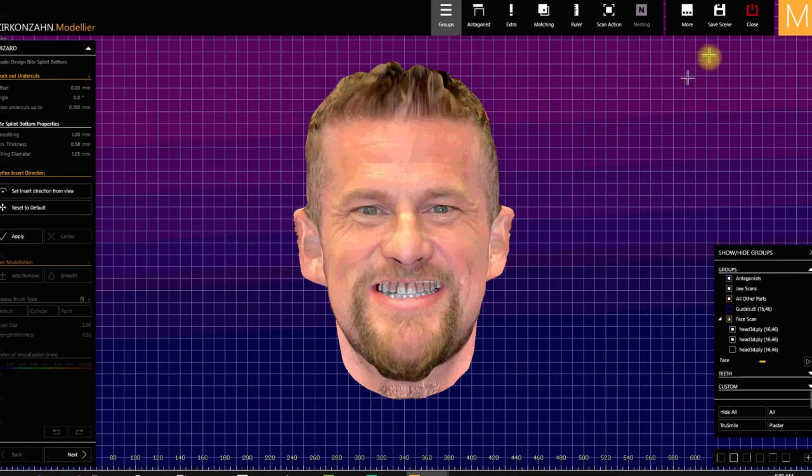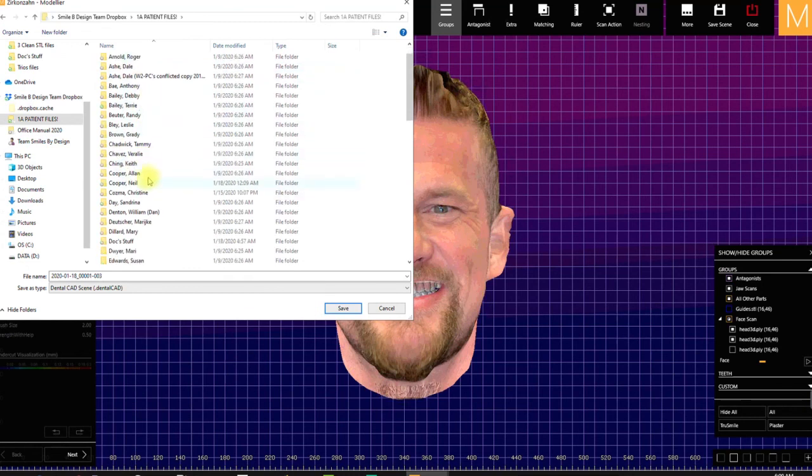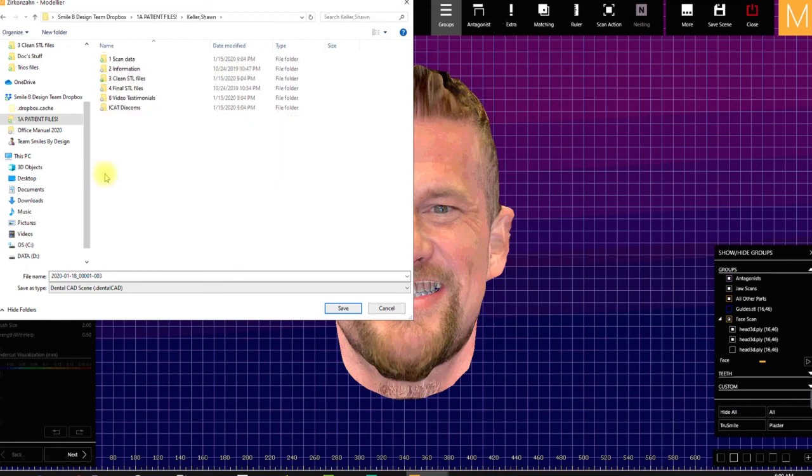Look at it straight on and go save scene. Yeah, put this in their Dropbox. Sean. Let's see, this is clean files, I guess.